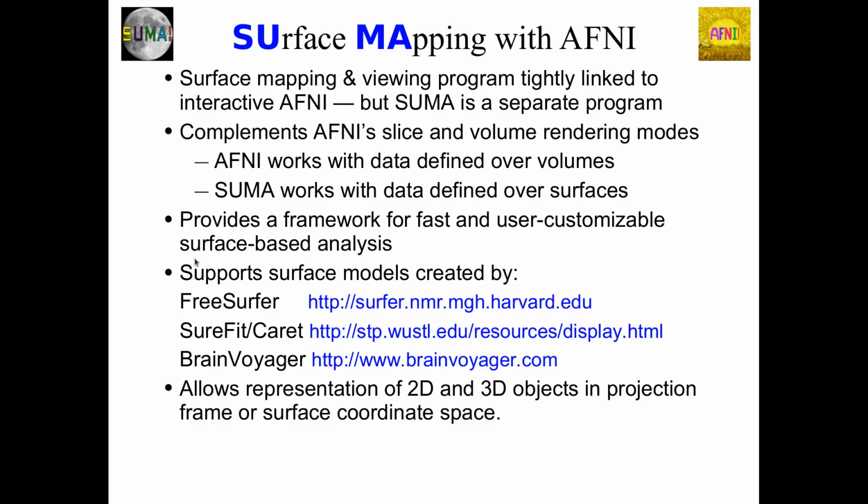But if you really want to know depth or some things like that, FreeSurfer is a very common software, and we'll see that there are tools in AFNI to bring the outputs of any one of these software packages into AFNI. And also recently there's been another software for generating surfaces for macaque brains called CIVET. And we'll see that similarly, the same things that we'll talk about here with basically FreeSurfer output for humans would also apply there. So there's still kind of growing functionality.